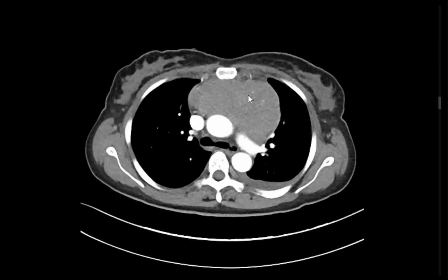The last question to you. What if there is a faint or suspected calcification within this lesion? I can bring up the bone window to make sure that it is calcification. What if it is proved to be calcification, especially on the pre-contrast study? My first differential would be a teratoma.